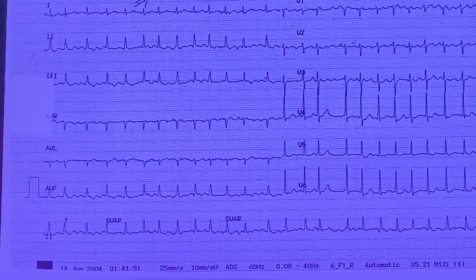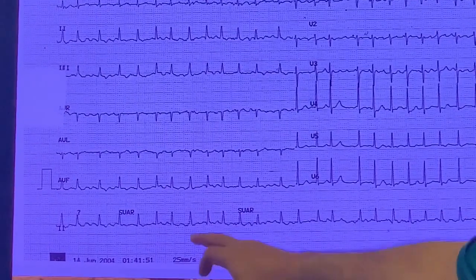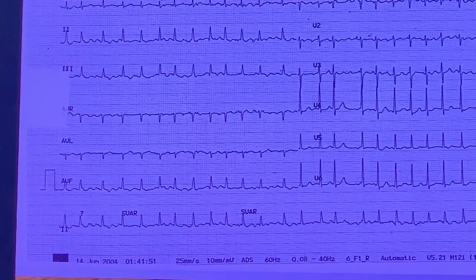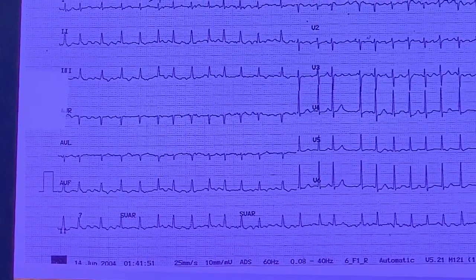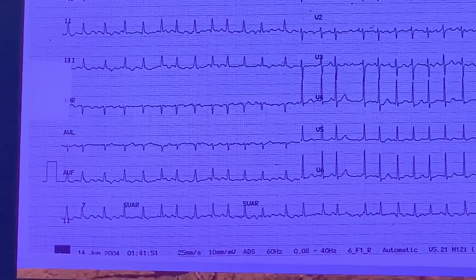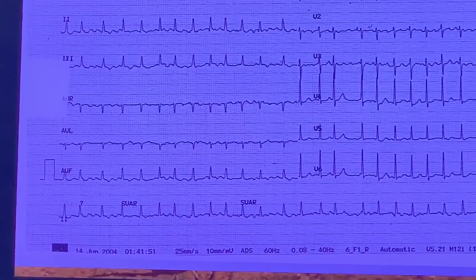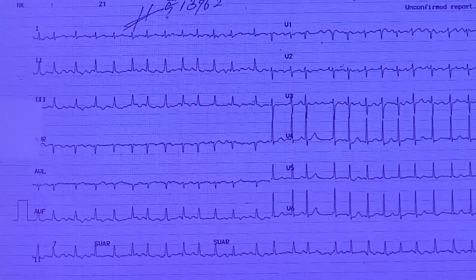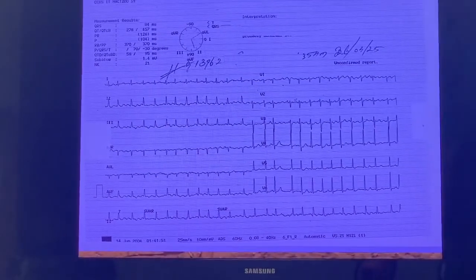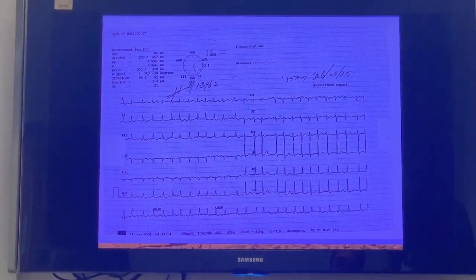Approximately. If you choose another 30, it might give 15. So that's why I'm saying approximately, because it is irregular. But if it is regular and I use that method, whatever I choose, my squares are going to be fixed with the same. Okay? Good.